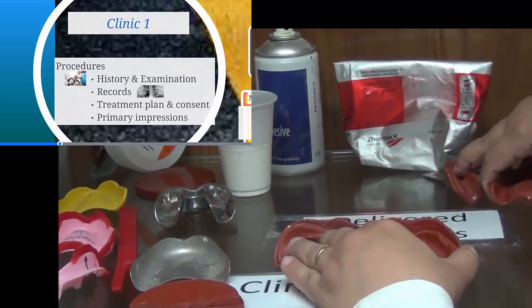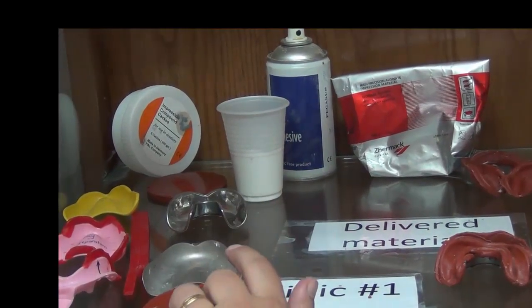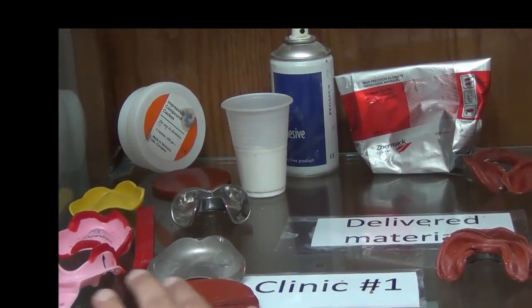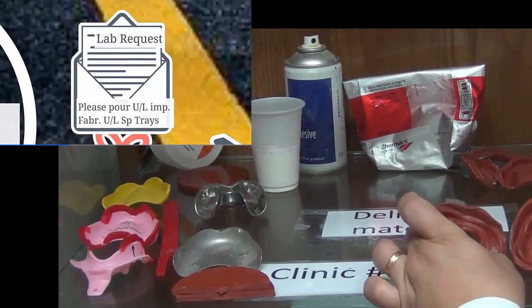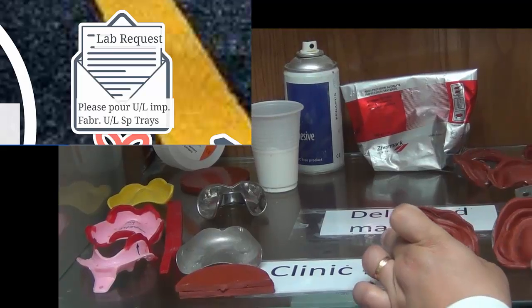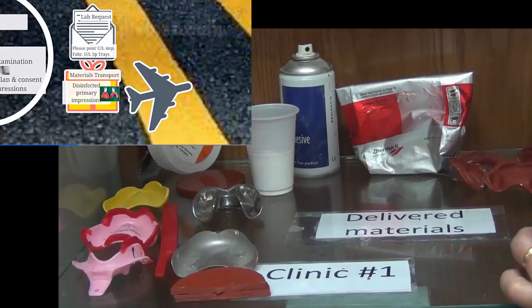So this was clinic 1. Clinic 1 was an examination. After the examination and the approval of the patient, we select trays and then we take impressions, and these impressions are called primary impressions. These are the delivered material. They go from clinic 1 to lab 1.